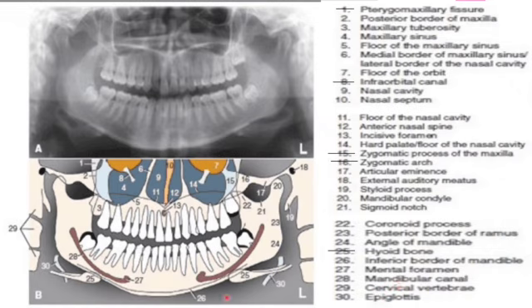Next is mandibular canal. You will see on either side a band of radiolucency, which is bounded by radiopaque lines. So this is the mandibular canal, which you will see on the right and the left side. Next is cervical vertebra, which is marked as 29. So this is the cervical vertebra which you will see on either side of the radiograph. On the radiograph you can see the cervical spine. Next is epiglottis. Epiglottis is marked as 30 in the picture. So it is overlapping the hyoid bone. Here again in the radiograph, this is the place where the epiglottis image will be seen.